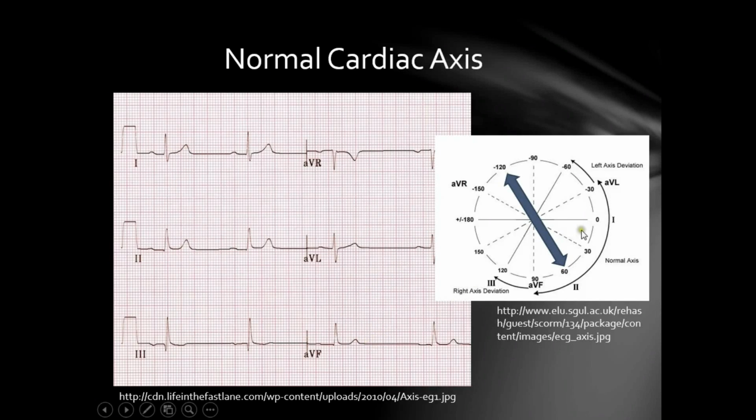So that means your cardiac axis must be pointing towards leads 1, 2, AVF, and 3. And so your cardiac axis must be pointing to the positive 60 degrees and not to the minus 120 degrees. You can confirm that also by seeing that AVR is negative, so it's pointing away from AVR. Again, the biggest advantage of using this isoelectric lead method is that you have a reference number, which is that the cardiac axis is at a 90 degree angle to the isoelectric lead.